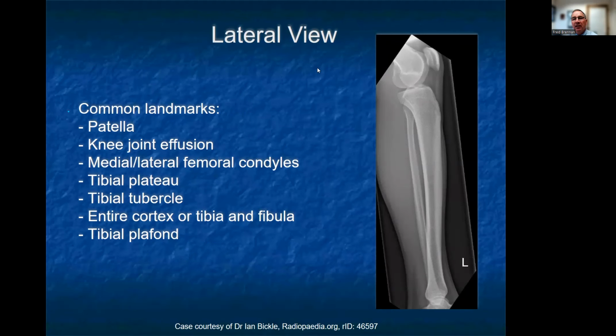So really the issue is having a systematic approach, whether you're looking at the femur and going on down, whether you're looking anterior and going on down, and then coming back up and posteriorly, whatever your technique is, just be consistent with looking at all the cortices, the tibial plateau, the femur and the femoral condyles, the patella, the tibial shaft, the fibular shaft, all the way down to the ankle joint. Just a nice systematic approach, whatever works for you.